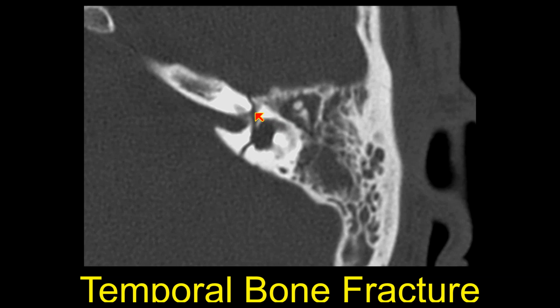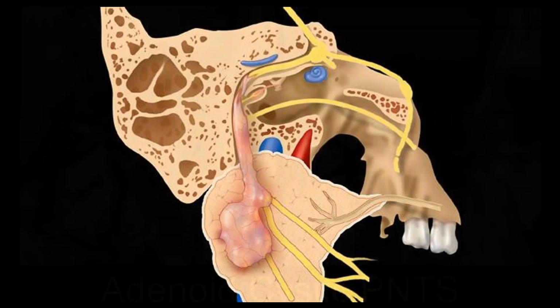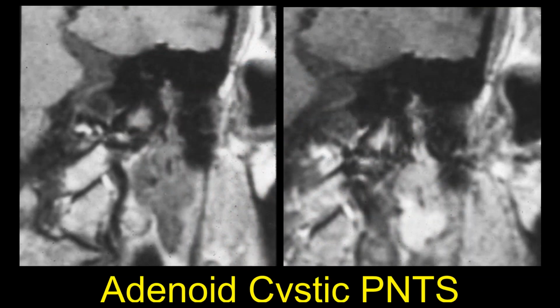And again, we have perineural tumor spread. Anytime we have tumors spreading along a cranial nerve, that may cause an isolated cranial nerve deficit. And this is a nice correlating case where we see a tumor within the parotid gland itself that's extending up the descending or mastoid segment. We see here before contrast on the left side of your screen and after contrast on the right side of your screen, where we see the enhancing lesion within the parotid and the perineural tumor spread extending up the descending or mastoid segment.